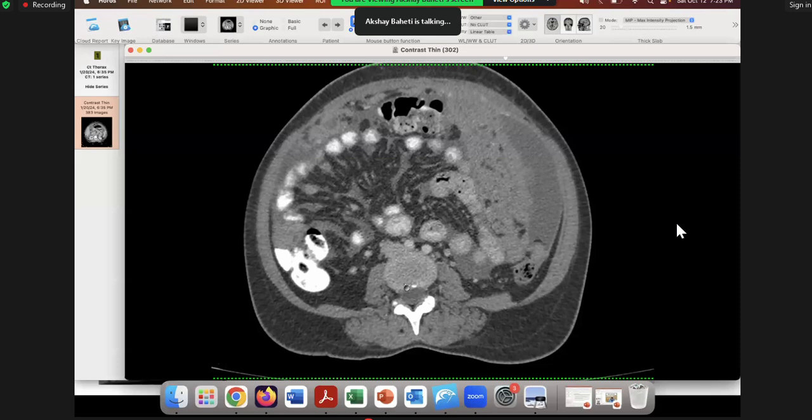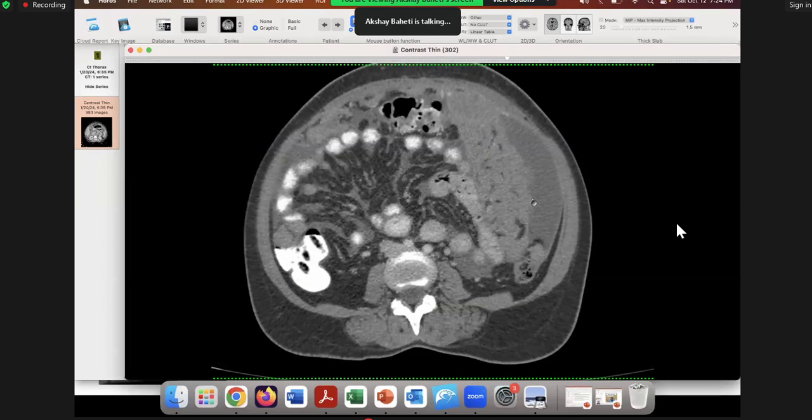Because they will say, I can resect peritoneum, I can resect omentum. You told me about the lesser sac. Thank you, that's great. I think I can still resect it, although it will be a difficult surgery. Hepatic hilum, I'll have a look inside and we'll see. Maybe I can resect it, maybe I can't. I'll have to open up and see. But tell me about mesentery, because if mesentery is significantly involved, I will not go in. That's what they'll say. So what do you think is happening here?